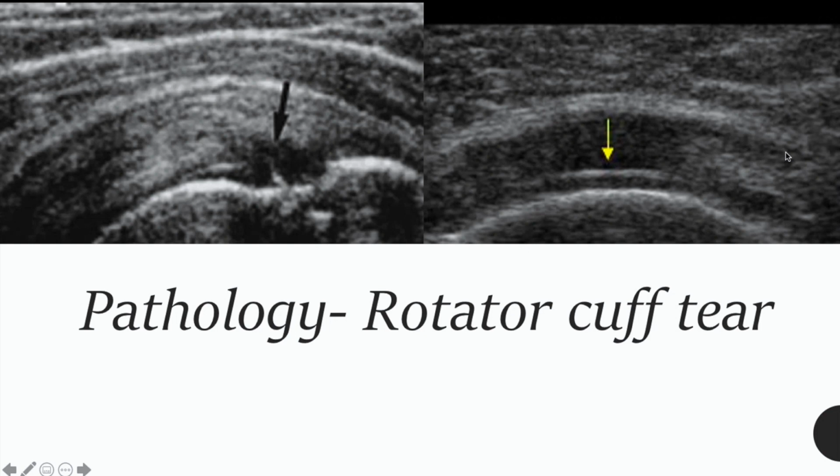You may see some cortical irregularity with a partial tear, but if the tear does contact the hypoechoic cartilage, the tear usually fills with fluid, and you can see increased echogenicity of the cartilage, and this is called the cartilage interface sign, seen on the right side. Next slide.